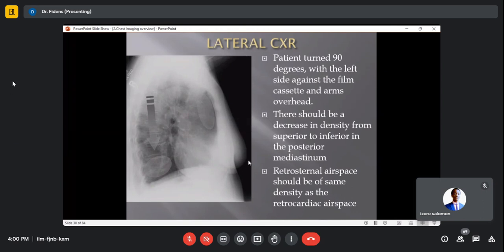The breast, these are breast. This is the sternum, which can be seen on lateral view if there is any sternum fracture or not. You see, the lateral view has its advantages, and it is complementary to frontal views, okay? It can be requested especially to locate a disease or to see the anatomy in the chest better, okay?